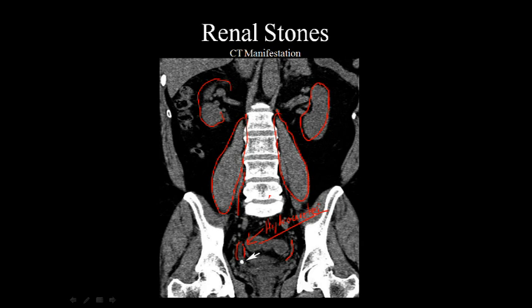So typically what we mean by hydroureter is that the ureter has urine kind of being pushed down in it, and it's dilating the ureter. And so that's what we're seeing here as well. One way that you can really keep, whether you're looking at a renal stone or a phlebolith, besides the oval and rounded shapes, is if you see any hydroureter, hydropelvis, hydronephrosis, things like that. That's what you're looking for, is things to be blocking and things are backing up.